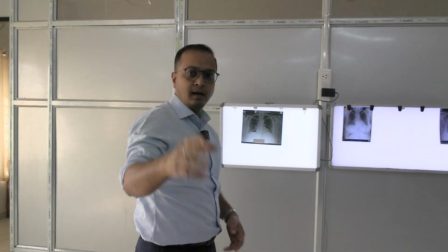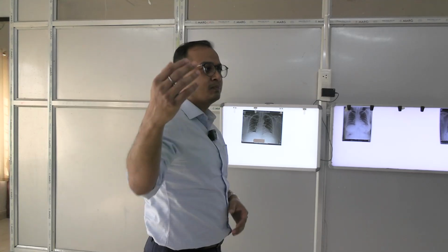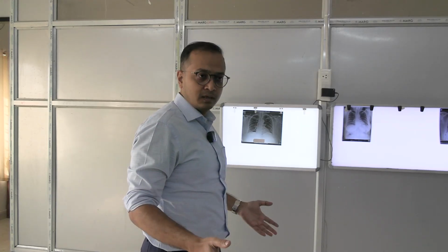That means this particular view we call posterior anterior view. In short, we call it PA view. Clear? Similar to it, if I stand in a side profile and this machine is on my side and the light is coming from the right side, penetrating it and going to the side posterior to it, we call it lateral view, because I am standing in a lateral position, which this particular film is revealing with these X-rays. It could be right lateral, it could be left lateral depending on which side I am standing. Clear? So, these particular views you have to see.